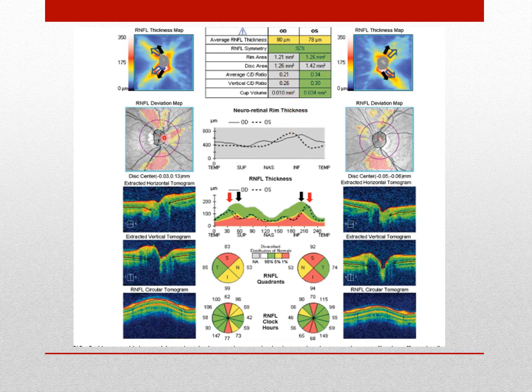And you can see here lots of neuroretinal rim in both eyes. And you see here too, when you're looking at the values, like 400 to 500 microns, a lot of thickness there. Going into the nerve fiber thickness plot.